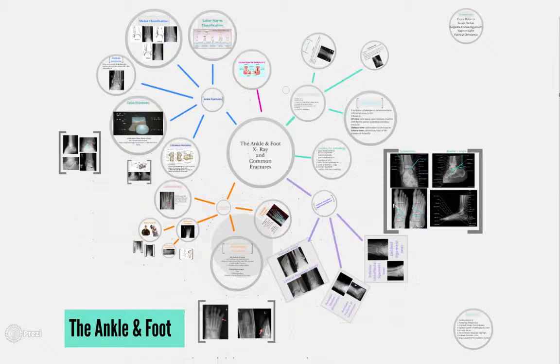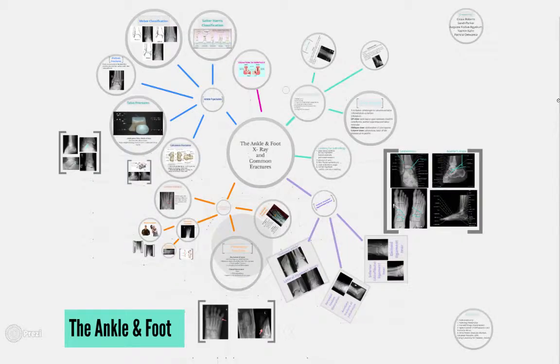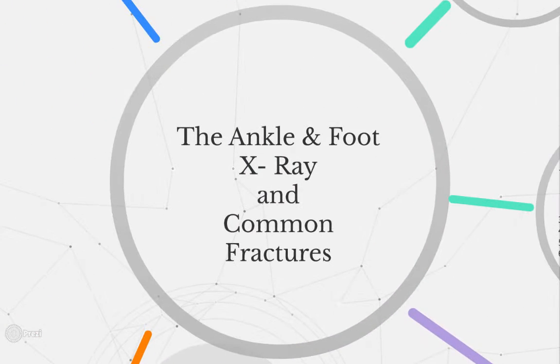In any emergency department, ankle injuries are a common presentation. Oh! Ouch, that must have hurt. Tyler the skateboarder could have one of two things. One, a ligamentous injury, or two, a fracture of the ankle or foot. In order to diagnose a fracture, you need to be able to interpret an X-ray. In this tutorial, we will discuss an approach to X-rays of the ankle and foot and how to recognize the common fractures thereof.